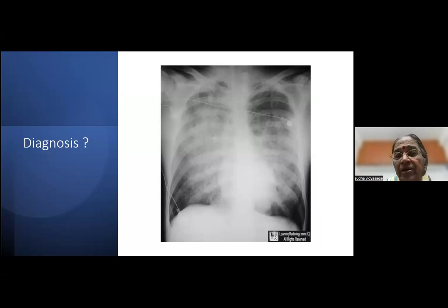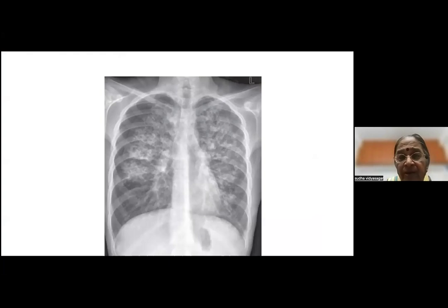What is that? That's probably simple. That's a pulmonary edema. Correct. See, you get your bat-wing appearance close to the heart. The peripheries are not very involved, upper part, lower part not very involved. And you've got a pulmonary edema there. It's inhomogeneous opacities on both sides of the heart with peripheral sparing. Correct. Okay. Go on to that. What is that?